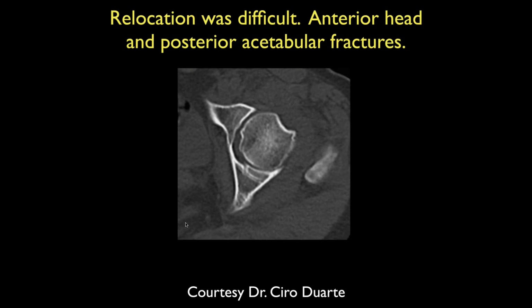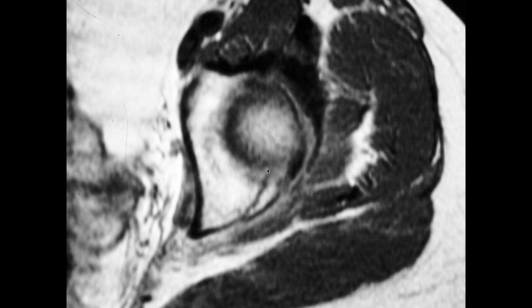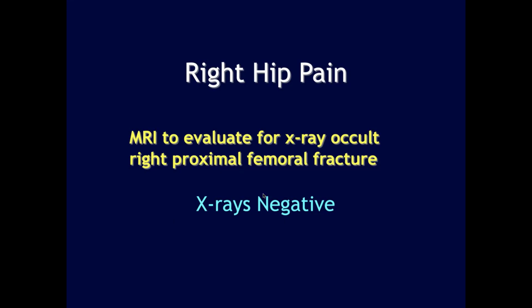So I think it's a different patient. I'm sorry. Oh, okay. So here's a fracture dislocation in this particular patient. Here's another posterior fracture here. Okay.